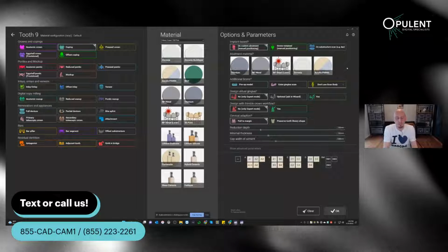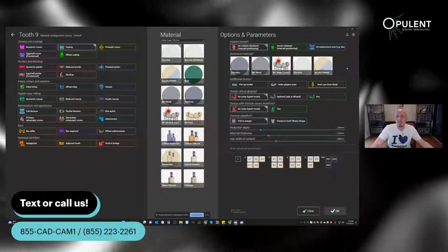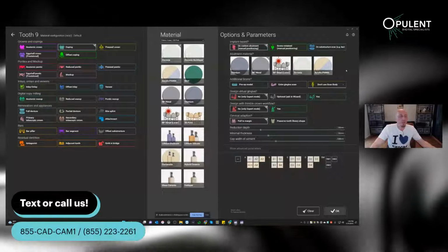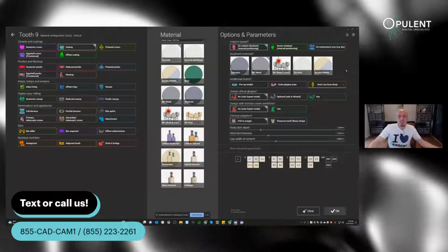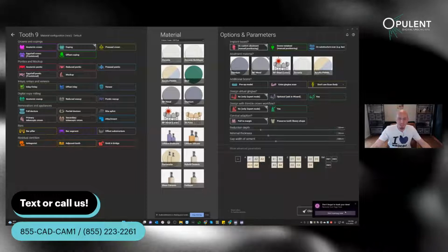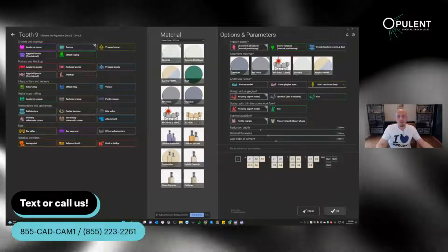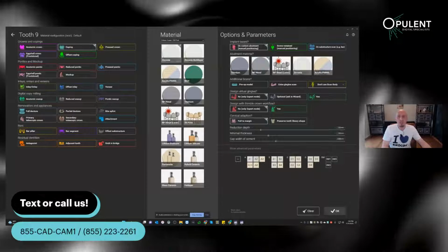And I want to show that, because it is really a nice option that you can go in and change the library. And if worse comes to worse, if you can't find the correct library, if these three options haven't worked, I then had libraries which friends gave me, where they're like, yeah, I know about that problem. Call somebody up or whatever.